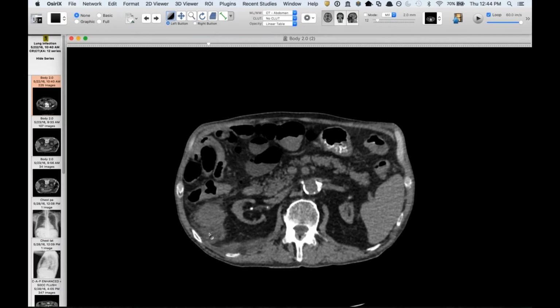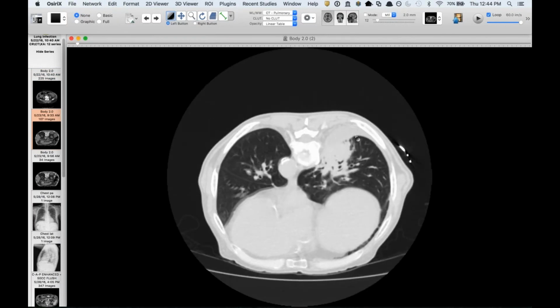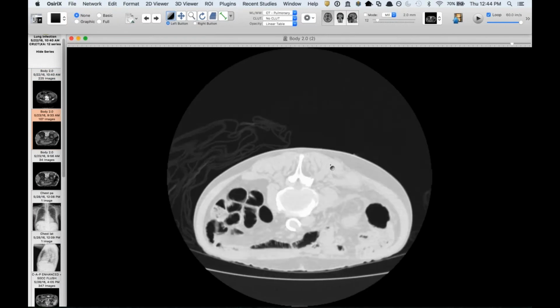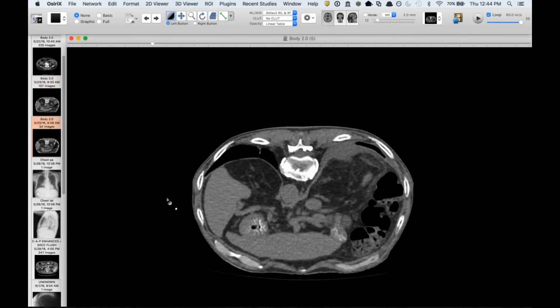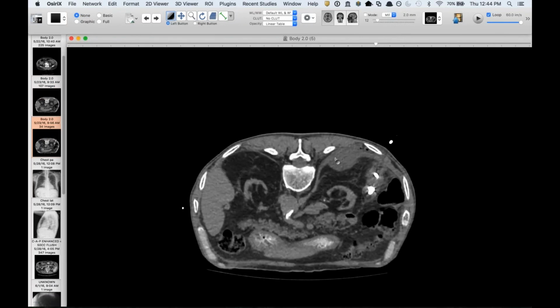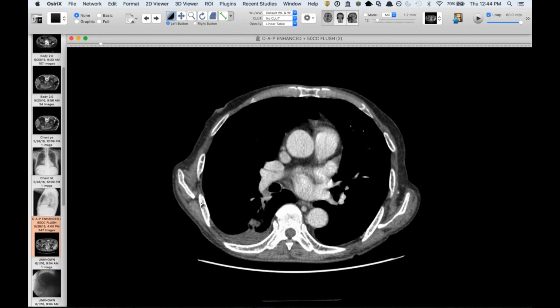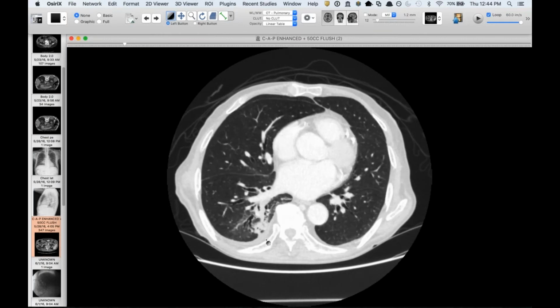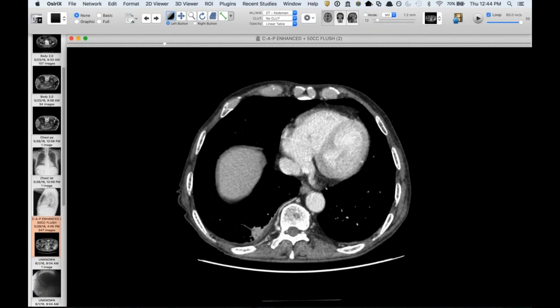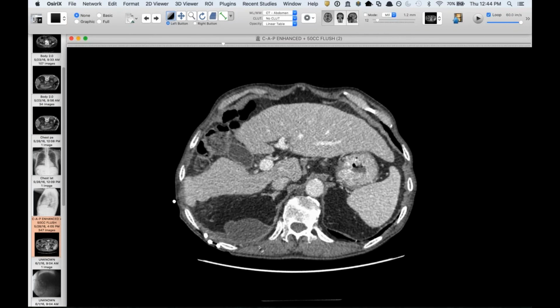And so, let's see, I'm trying to figure out what order. This was when they were doing a drainage of that. They actually show the pneumonia and the consolidation better. And of course, whenever you have something that looks like it could be contiguous, it's probably more than just coincidence that both things are there. This is the actual chest CT that I saw. You see he still has this consolidation with a few small cavities, a small effusion, a little bit of pleural thickening, and then this thing that kind of tracks directly into this.